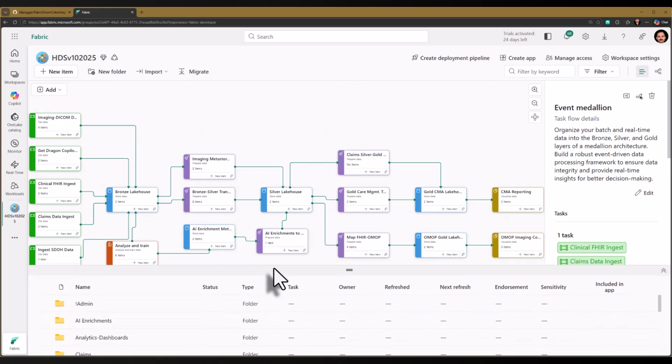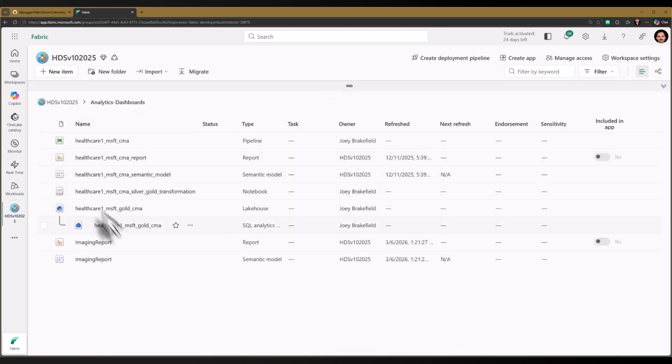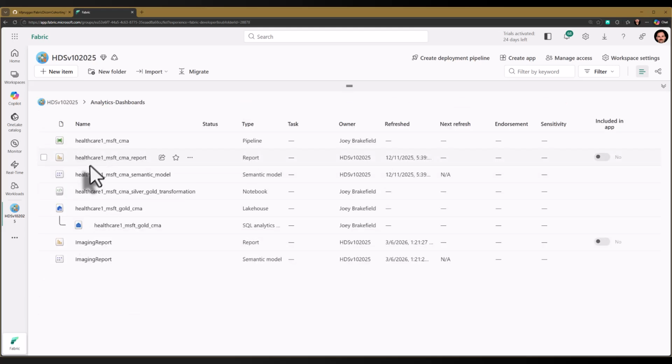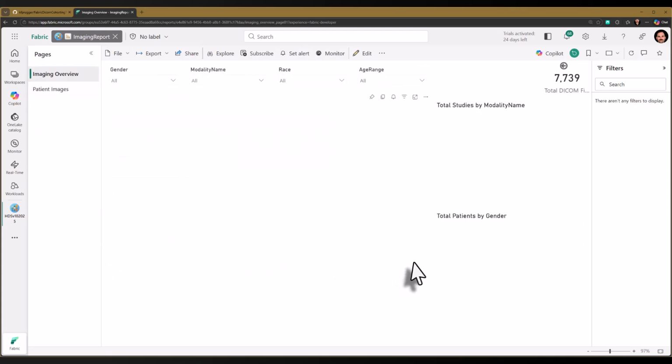All right. Now that that's there, we go through and take a look at first the dashboard. I've broken mine up into some handy little folders here. You can feel free to use whatever you like, but we're looking at dashboards specifically. And this dashboard, along with the semantic model, comes out of the GitHub repo that I just showed you before. So after it's deployed and published, it will look like this.